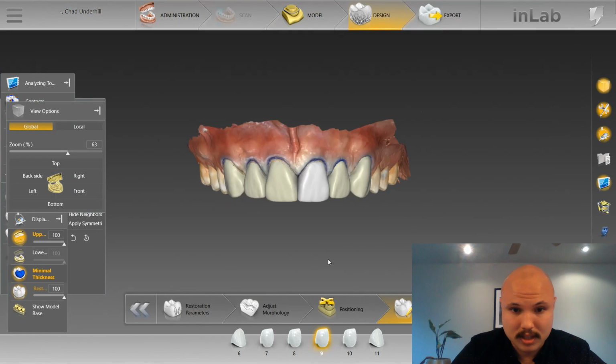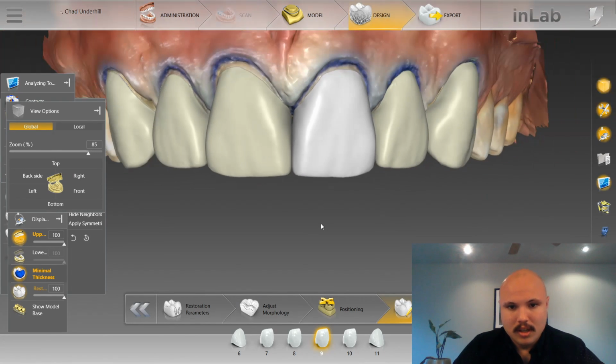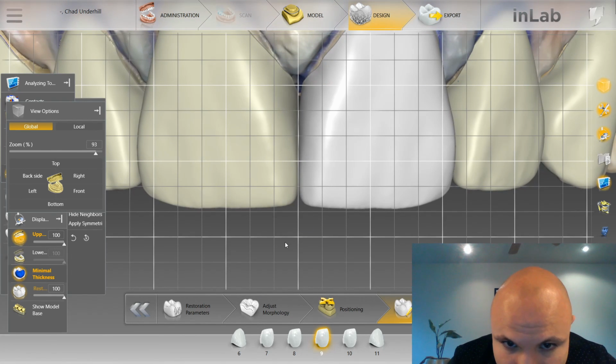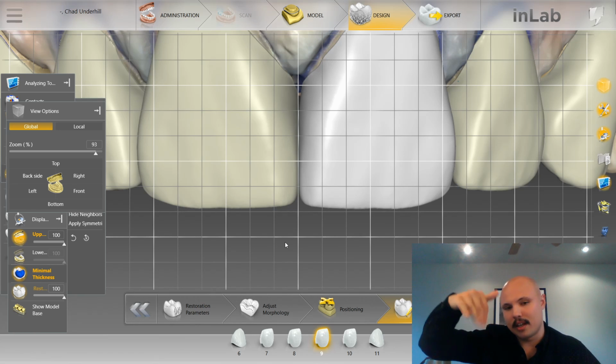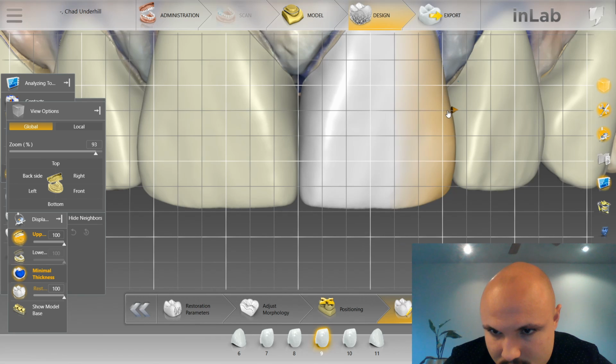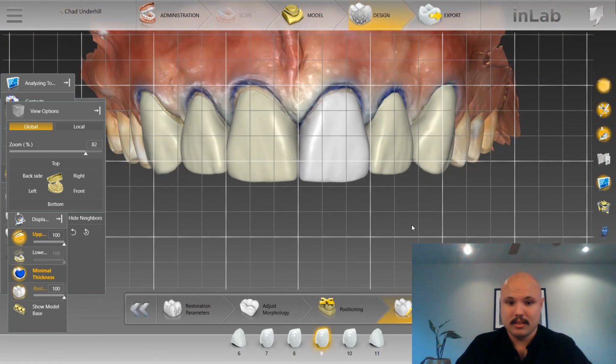Maybe not though, let's see. Yep, and then let's check the grid. It might be canted a little bit this way, but it's not something that is worth even touching, to be honest. Not for the sake of this video, at least.